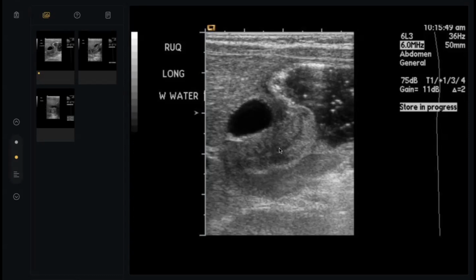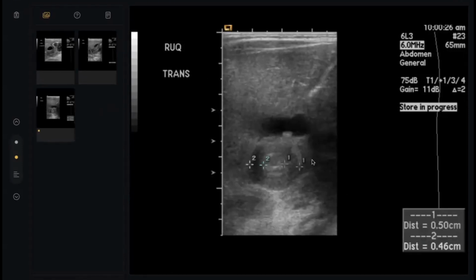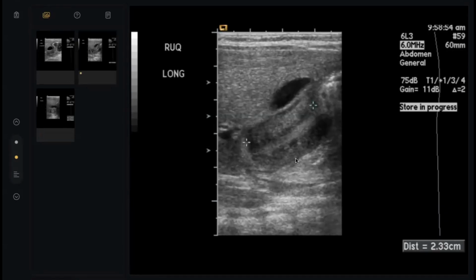One question: what is the normal longitudinal length from here to here? Sir, I think it should be less than 14 millimeter, and more than 16 millimeter is suggestive of HPS. So it is a longitudinal length. What is the normal of the transverse, from here to here? This is transverse because this is axial. Normal is less than 13 millimeter. Okay, 13, 14 is acceptable.